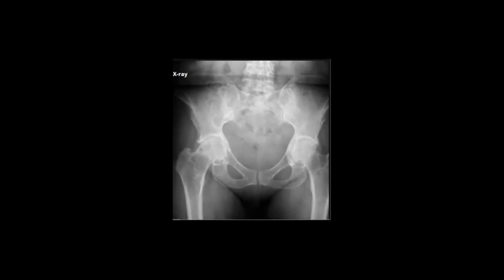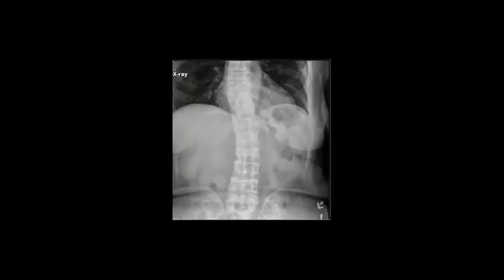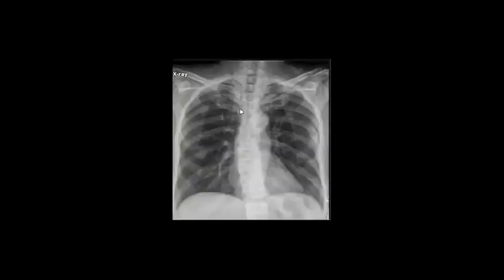And if I show you more and more, yes, so there is disseminated focal regions of lucency. So in the background of osteopenia, and there are some rib fractures. So you are talking about multiple myeloma as a first possibility, especially if the age is supporting.